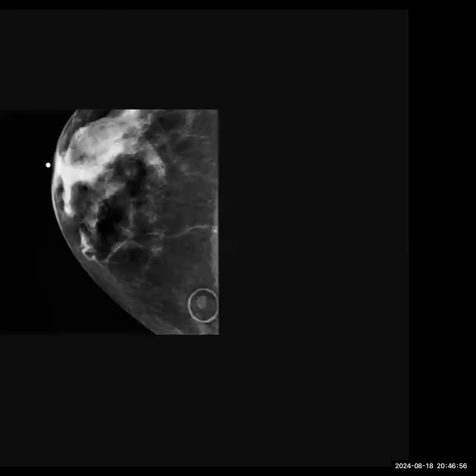Okay, coming to this case, sometimes you can be given a lot of markers, and in the NHS they use a lot of markers, and those are very specific markers for different conditions. This is called a mole marker. This is to mark so that the reporting radiologist knows that this lesion is confined to the subcutaneous plane and it is just a mole. It's a benign thing, so don't overcall this as a breast lesion.